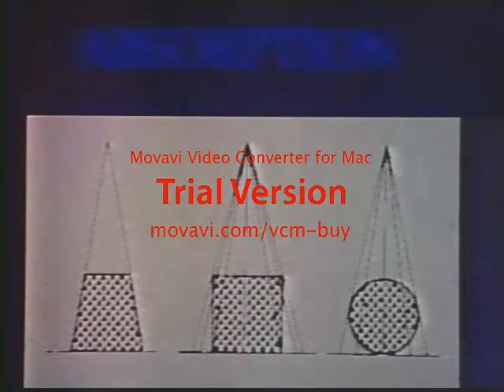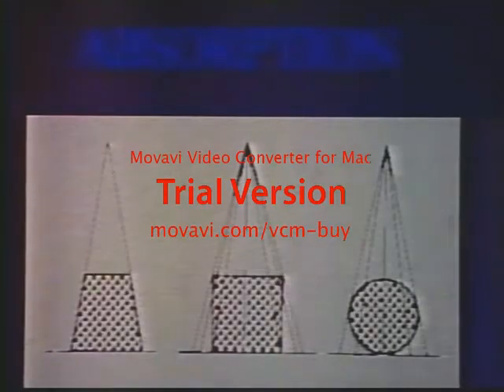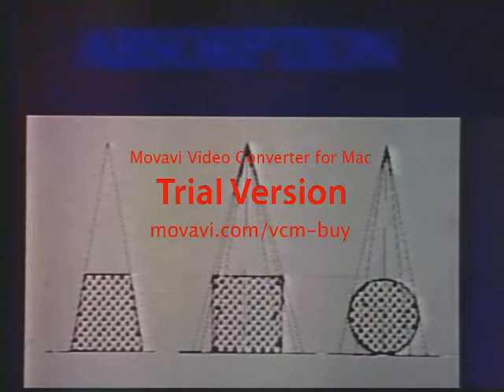Absorption unsharpness has to do with the alignment of the beam with the margin of the object. If we look at the left-hand object, you'll notice that the beam is aligned with the edge of the object, and therefore the margin will be clearly identified on the radiograph. If we look at the right 2 objects, there is uneven absorption since the margins are not aligned with the primary beam. This will result in a less distinct margin on the radiograph.